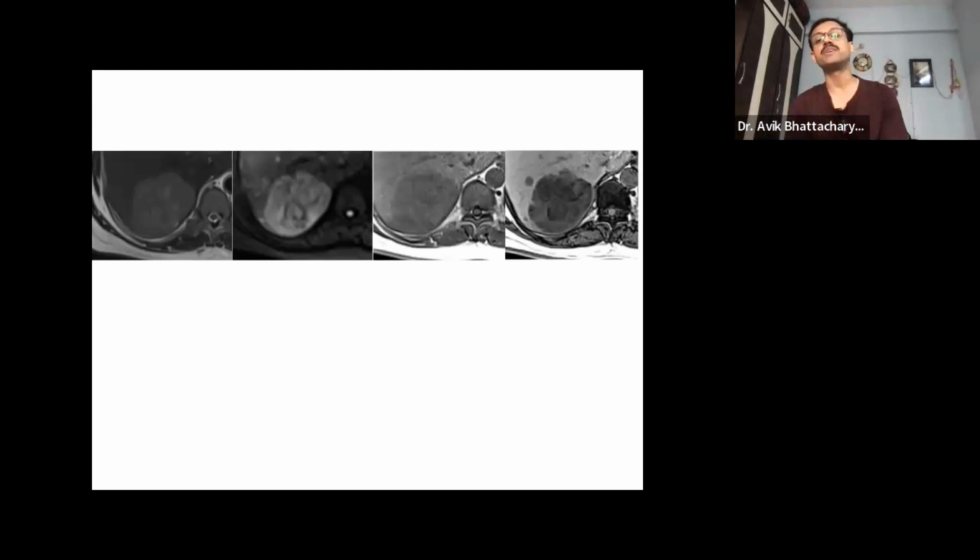So seeing this picture, I am very sure this lesion has a significant amount of fat inside and is a hypercellular tumor. These 2 pictures show cellular and molecular level pathological changes of hepatocarcinogenesis, and we are transforming those molecular changes into our imaging interpretation, telling us this patient has a lesion which is not benign. Most likely we are dealing with a hepatocellular carcinoma.